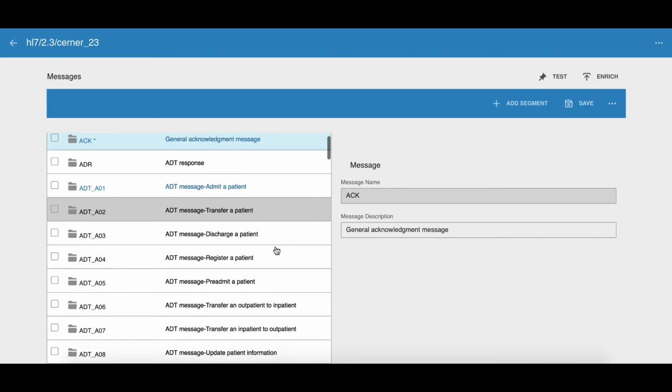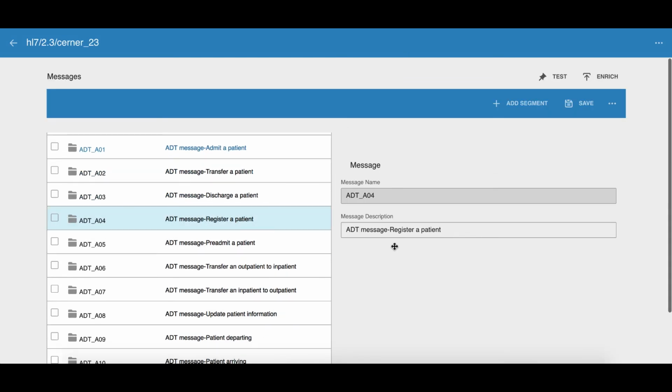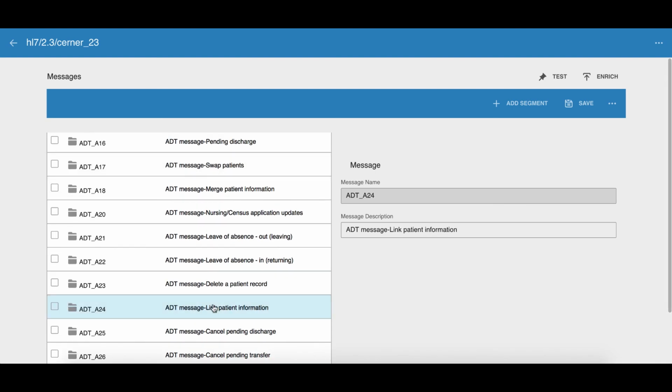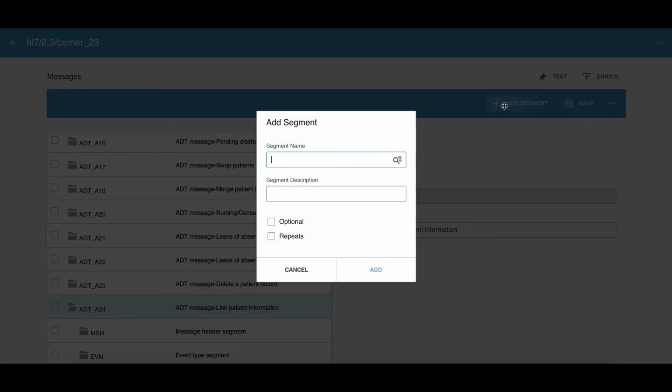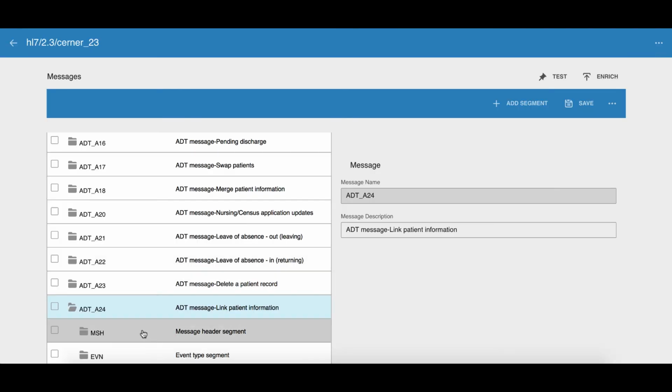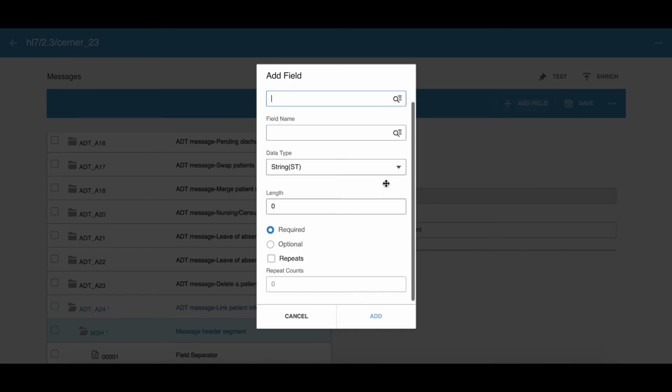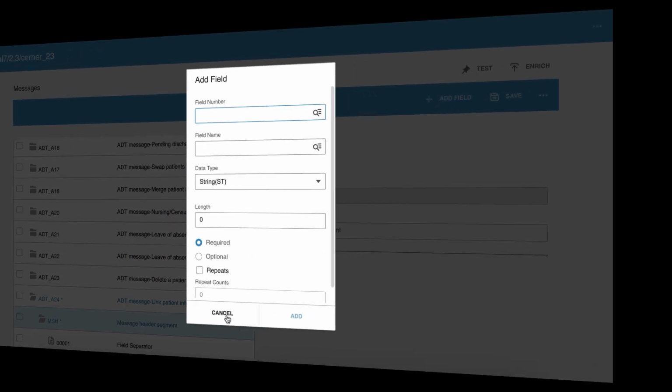Finally, with the HL7 variant builder, the wizard user can input sample variant messages to begin creating a variant and add additional information, configuration changes, or edits to the variant as needed. These variants can be used in translations by the developer without the developer having to take time away from their work to create or update the new variants.